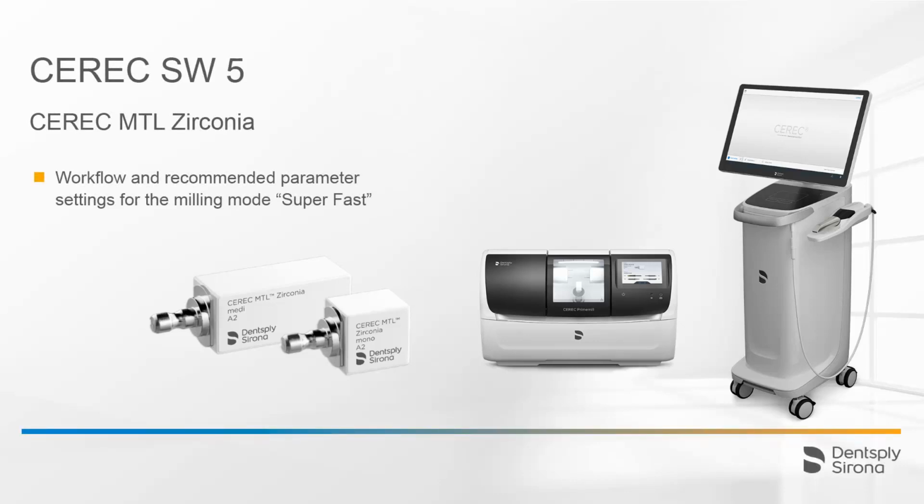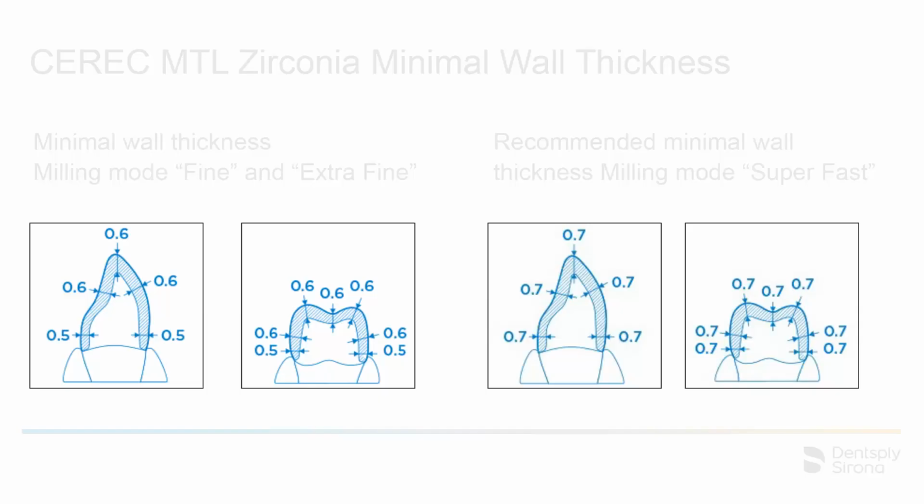Welcome to this video tutorial on the topic of CEREC MTL zirconia. In this video, we would like to show you the workflow and recommended parameter settings to be observed in the CEREC software, especially in the case of the super fast milling mode.